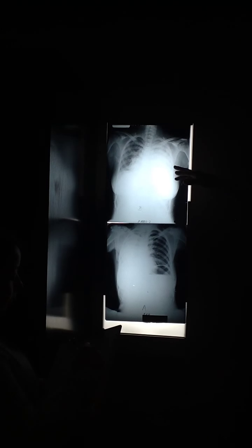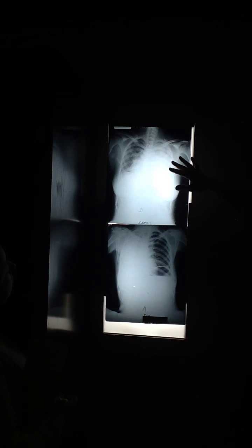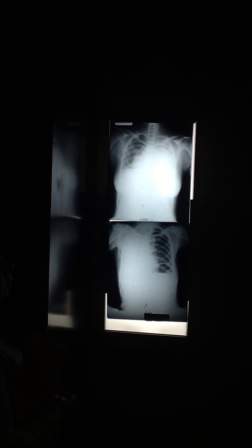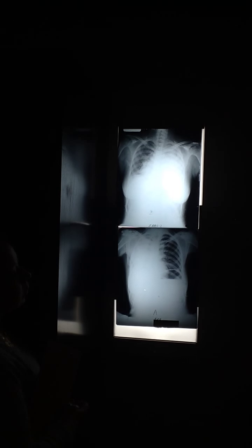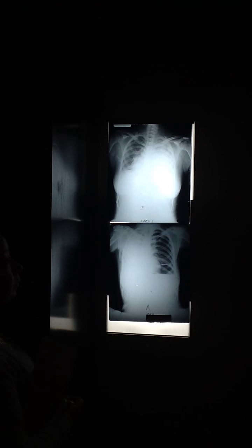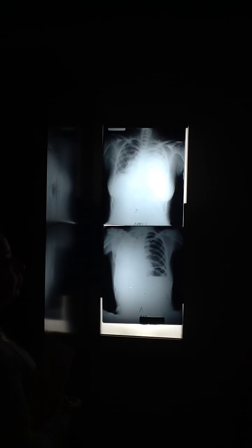Well, up here, this patient has atelectasis, but you can't see it. This patient has a very large pleural effusion. And so the pleural effusion is causing what kind of atelectasis? Compressive or passive atelectasis. Exactly. Which is squeezing in on the lung. What density does the lung become as it collapses? Water. Surrounded by a big pleural effusion, water. Water, water, so where's the lung? Can't see it. It's silhouetted.